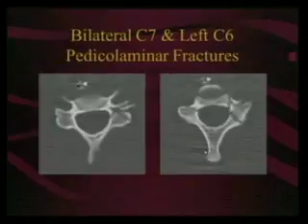Things feel very subtle. It is very much so. But the key is to see, even though I don't think anybody would expect any one of us to look at it and go, oh my God, they've got bilateral C7 and left C6 pedicolaminar fractures. What I want you to be able to do is look at it and go, something's not right. There's something that's not right here. We've got to see this. Okay?